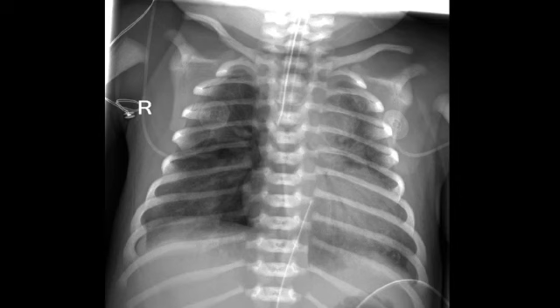Single view of the chest on a neonate. There's an endotracheal tube terminating at the carina. The umbilical venous catheter terminates in the right atrium. Normal cardiothymic contour for the patient's age. There's a small right pneumothorax, which is most notable along the mediastinal contours and also within the interlobar fissure. There are diffuse fine granular opacities of the lungs consistent with RDS, no pleural effusion, and unremarkable osseous structures.